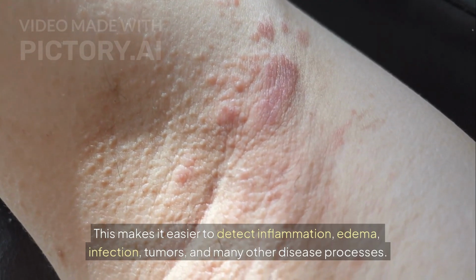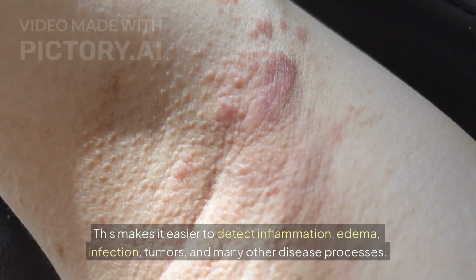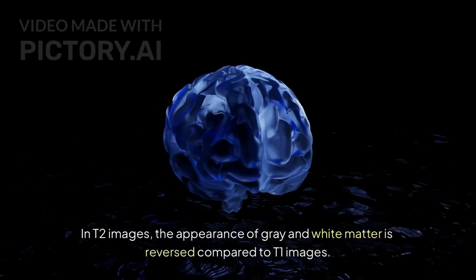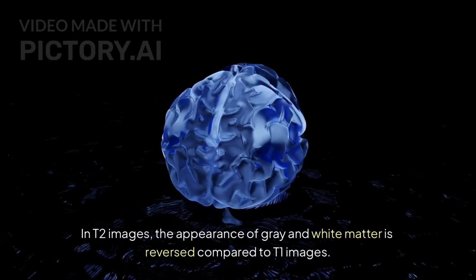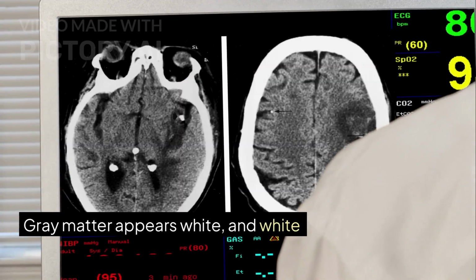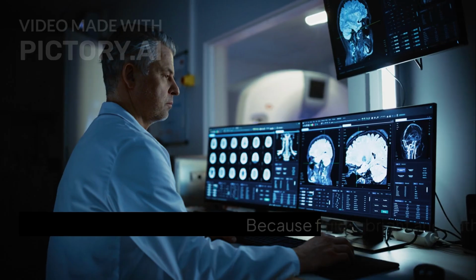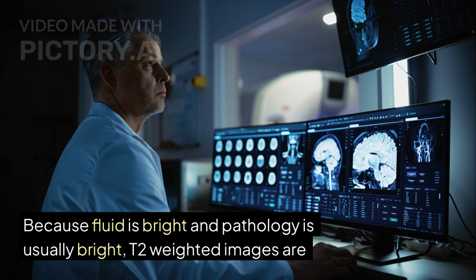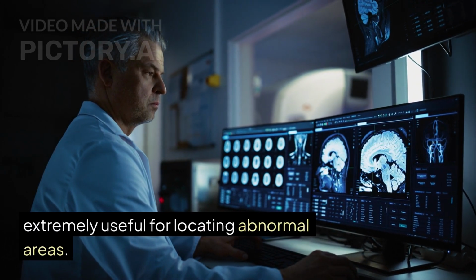This makes it easier to detect inflammation, edema, infection, tumors, and many other disease processes. In T2 images, the appearance of gray and white matter is reversed compared to T1 images. Gray matter appears white, and white matter appears gray. Because fluid is bright and pathology is usually bright, T2 weighted images are extremely useful for locating abnormal areas.